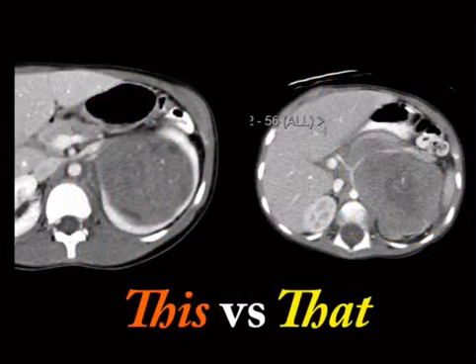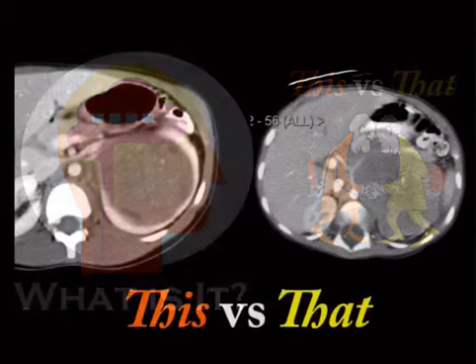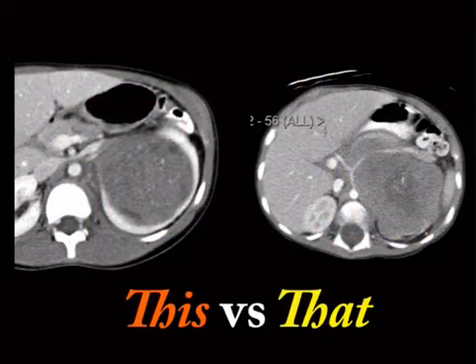So, moving on, comparative case here. Now we move into a solid organ. Both of these things are in the general vicinity of a kidney. One of them has a claw sign, so this is clearly coming out of the kidney. It'd be a little bit easier if it was shown on a coronal view, but don't expect everything to be easy. And then this one here, not necessarily seeing a kidney, as for the purpose of gamesmanship. If they want you to know it's coming out of the kidney, they're going to show you the kidney. They're going to show you a claw sign. If you don't see a kidney, I would assume that it's not coming out of the kidney.